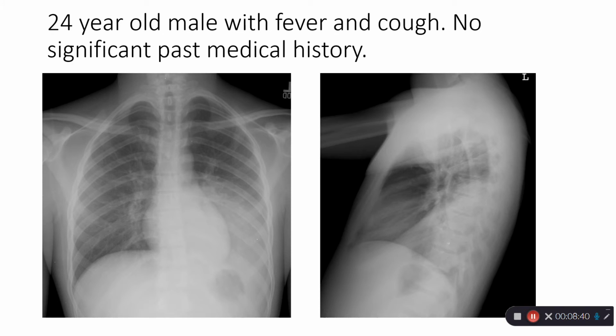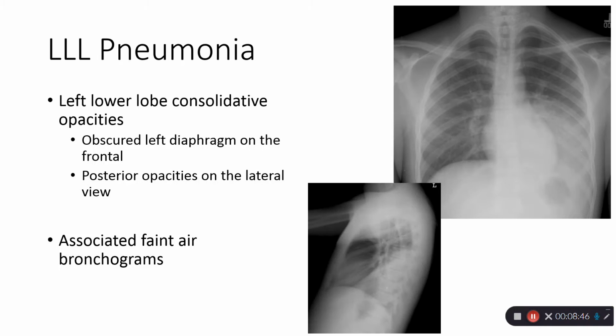24-year-old male patient with no past medical history, presenting with fever and cough. So we see this abnormal opacity on the frontal view. It obscures the left diaphragm, posterior on the lateral view. So we know that this is within the left lower lobe. So left lower lobe consolidative opacities with faint air bronchograms here. This is an example of a left lower lobe pneumonia.